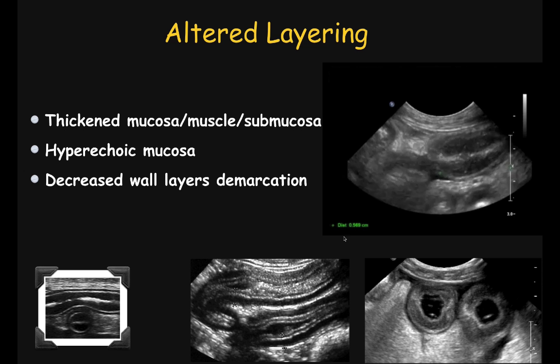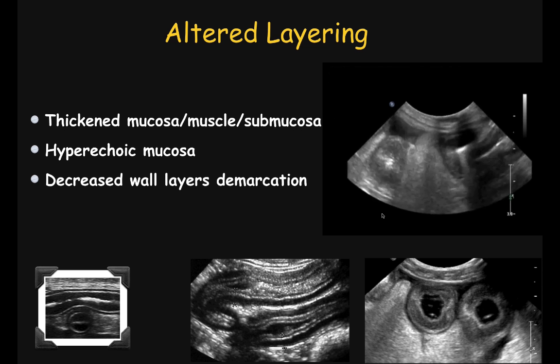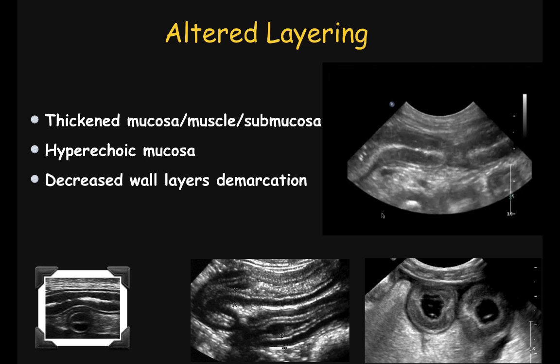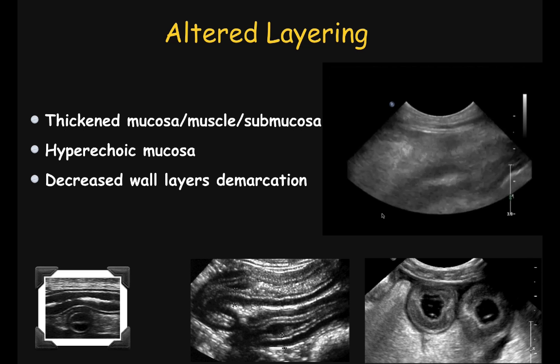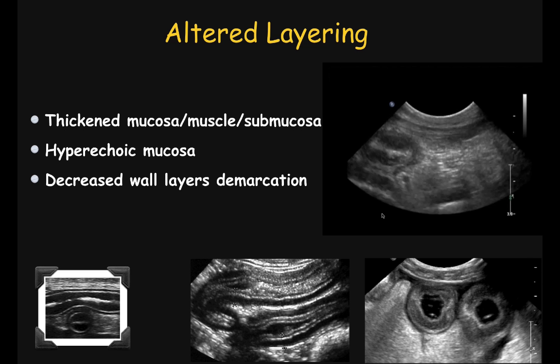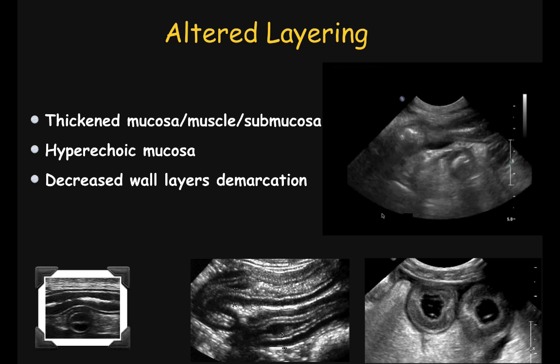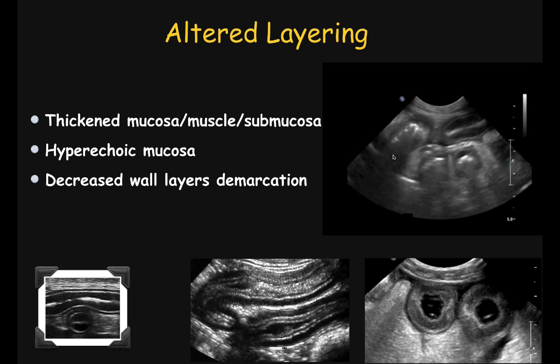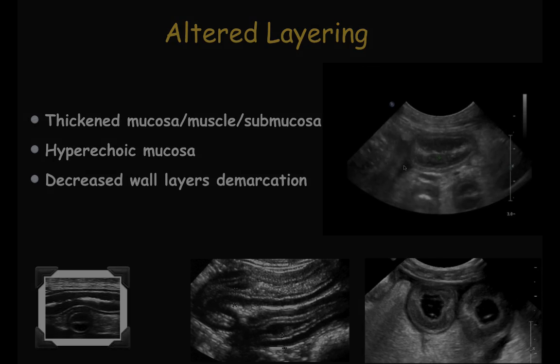The wall layer also led to an increased thickness of the intestinal wall, up to 6 mm, which is too thick in this small-sized dog. In addition, the fat near the bowel segment is slightly hyperechoic. That may be the result of that free fluid in the abdomen.